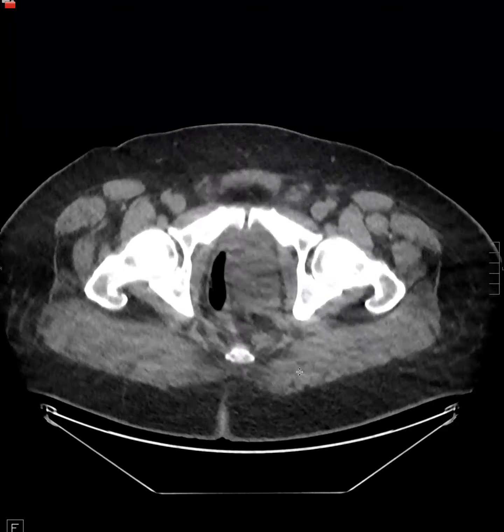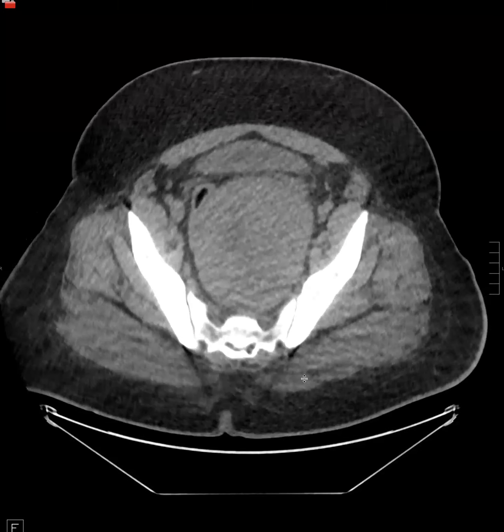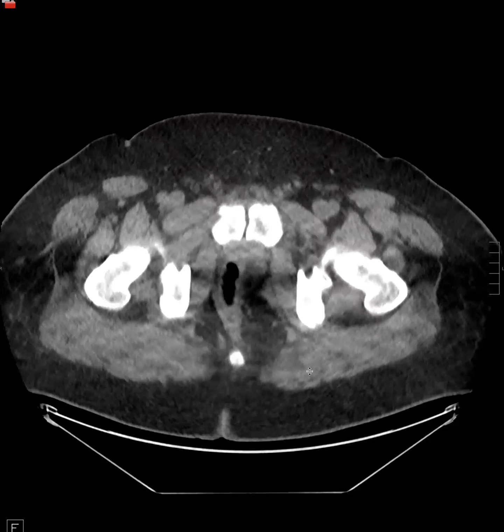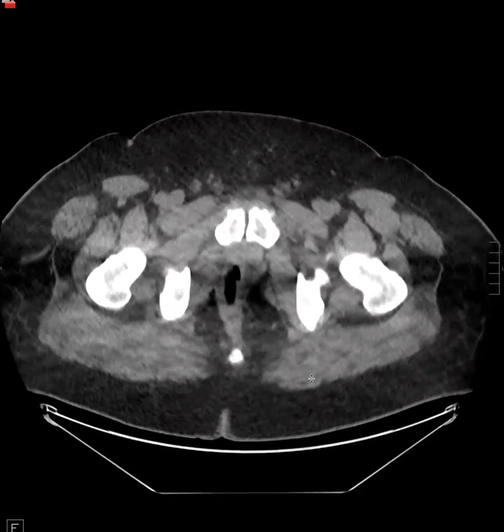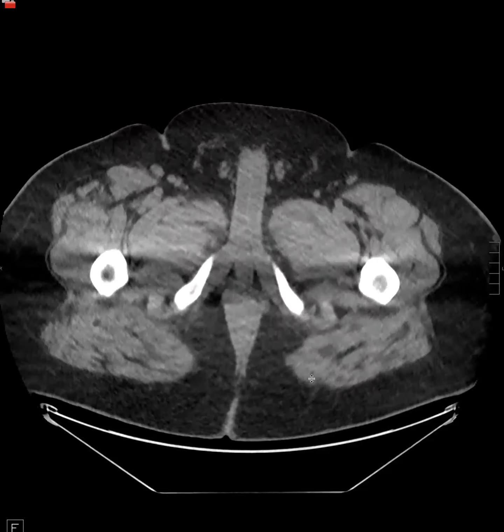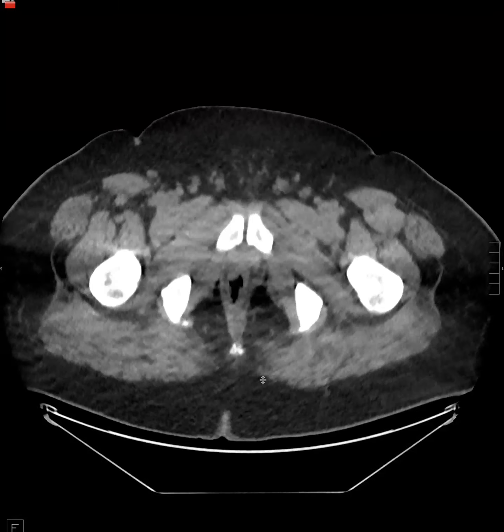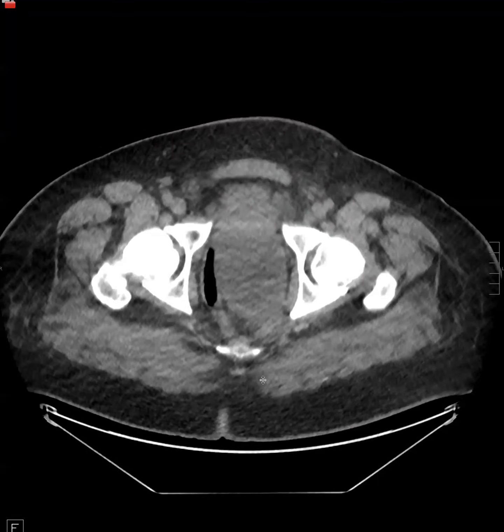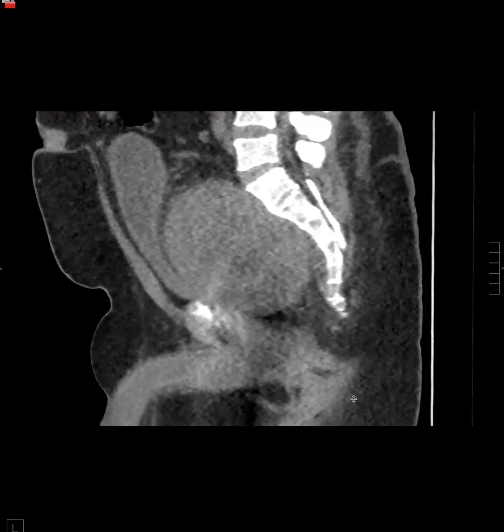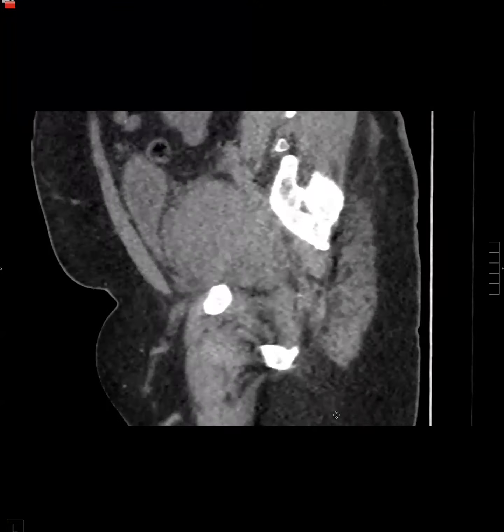Okay. This is an outside CT. Male patient? Mm-hmm. Okay, so massive. Well, the prostate looks separate. I see the prostate down there, and I see a large pelvic mass that's touching the prostate. If you go up, I feel like I see the prostate right there. So it's either exophytic from the prostate or just touching the prostate. It's also touching the sigmoid colon and rectum. So GIST is in the differential, or some kind of mesenchymal tumor arising from the prostate or seminal vesicle.